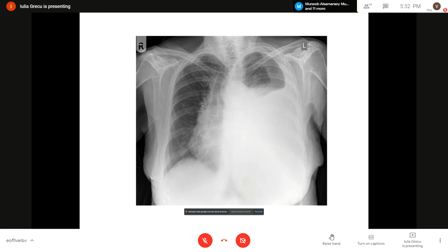The superior border is ascending on the lateral thoracic wall. The superior border is concave, and also, if it is a large pleural effusion, it will determine a shift of the mediastinum, moving it to the contralateral side.